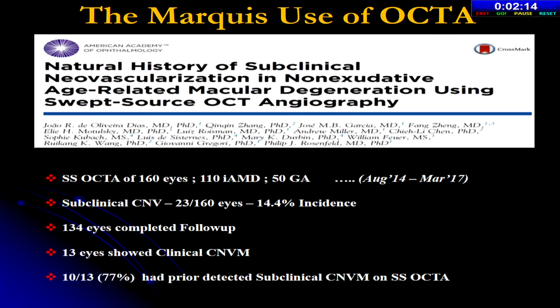But as of now, one of the marquee and recognized uses of OCTA in AMD is subclinical neovascularization in non-exudative AMD, with a beautiful study brought out by Dias et al. From Dr.